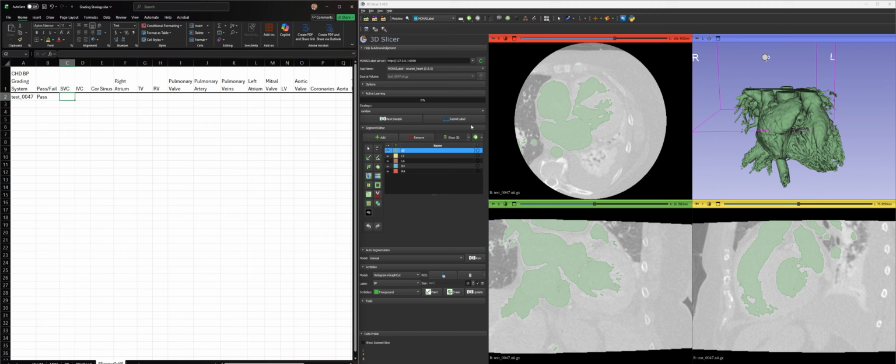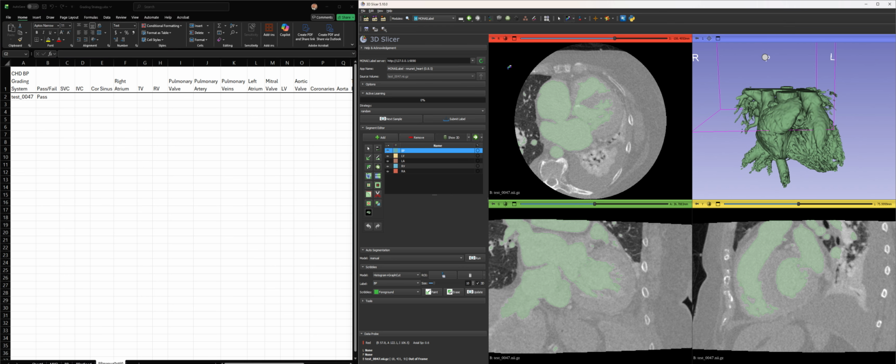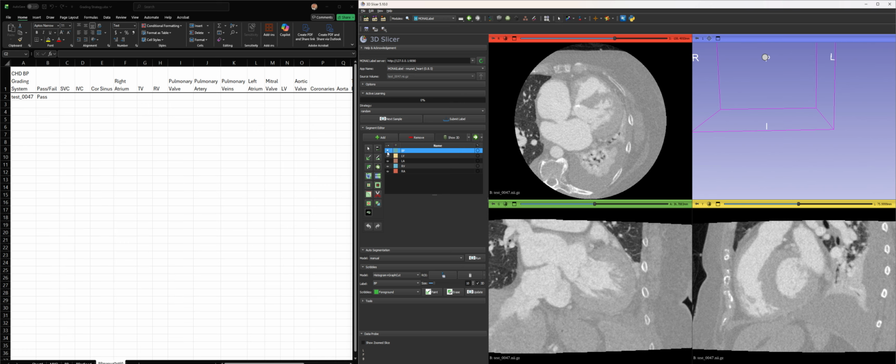And I usually don't have to mess around too much with this, but this one, the contrast seemed to be a little off. And so I'm already sort of taking notes that here in the ventricle I can see some changes. I'll toggle it on and off if I have questions, and so already I'm like, oh, there's going to be some mitral valve. This is decent, I think this will have some good high numbers.